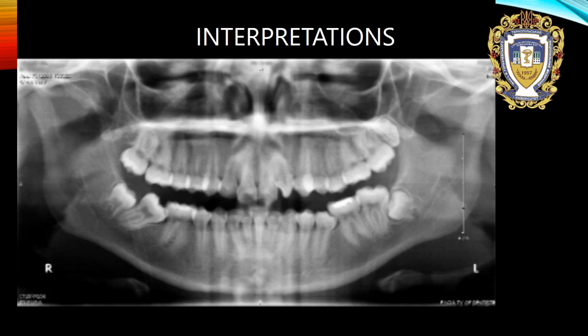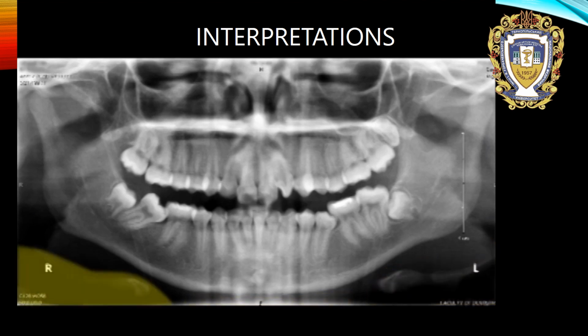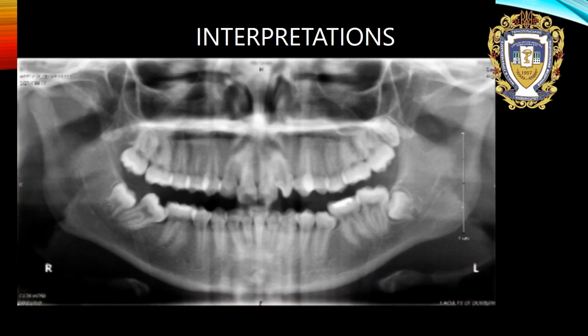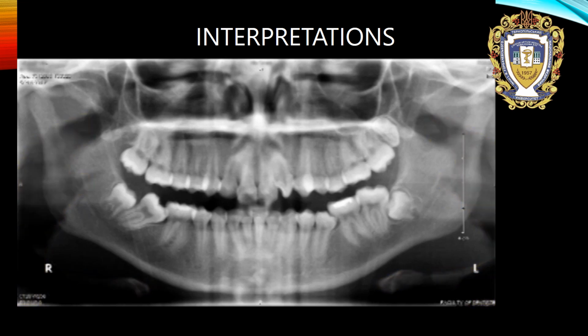Begin by assessing the periphery and corners of the image. This is a good habit because often observers are too occupied with looking at the center of the image, zoning in on the teeth and jaws, and the outer edges of the film are neglected. In these areas, the orbits and the skull base, including the articular process of the temporal bones, are assessed, and the contents of the neck, including the pharynx and hyoid bones, are seen. The cervical spine, styloid processes, and any calcifications in the submandibular glands may also be present, but are not captured in this image.